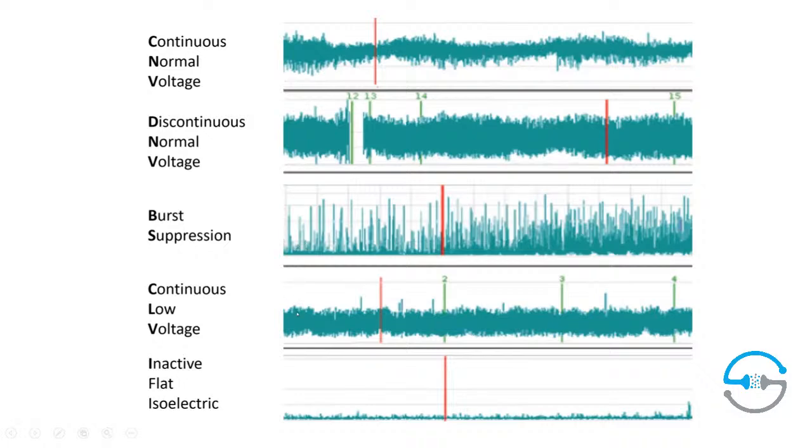So we want to think about an injured brain on this spectrum of normal activity to a little bit of a lack of normal voltage, so the drifting. Then we want to think about overall, how strong is the brain? Does it even make any bursting at all? Is it ever reaching above 10?